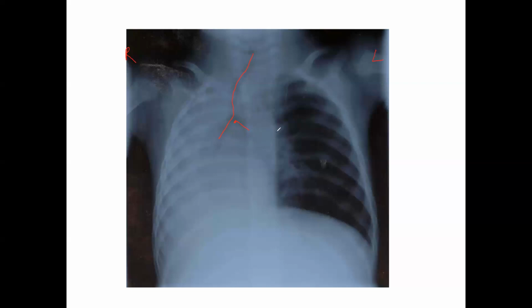So if you remember that from your pathophysiology course, basically what we're looking at here is a tracheal shift, and this tracheal shift is due to the increase in opacity that we see over here, and the increase in opacity is due to atelectasis, consolidation, and likely pneumonia that this patient's got going on. So that's what we see here. That trachea should be more midline.